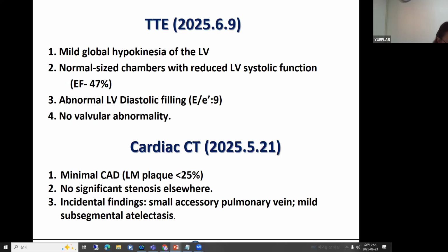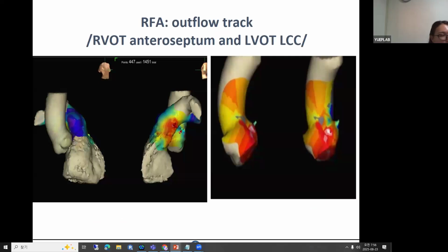Now, what did you do? Did you do anything to the patient, or did you map the patient? Probably the operator suspected a PVC-induced cardiomyopathy. Septum, LCC. So it's between the two. So a single point ablation eliminated all three PVCs? No, not a single point ablation. You ablated both sides, it looks like.